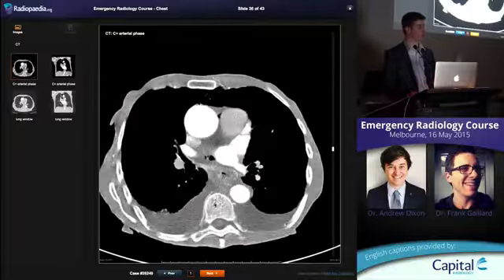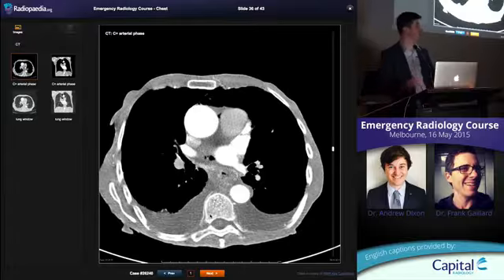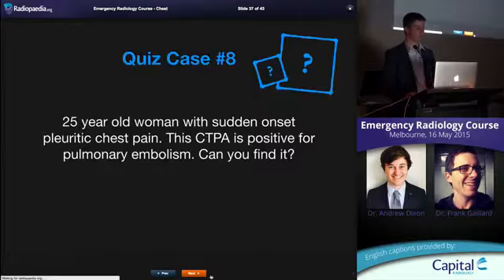All right. So if you're looking at your plain film and they've got pneumomediastinum but they've got perfectly clean costophrenic recesses, no pleural effusion, that's going to be an airway. These people are very unwell if you've ruptured your esophagus.